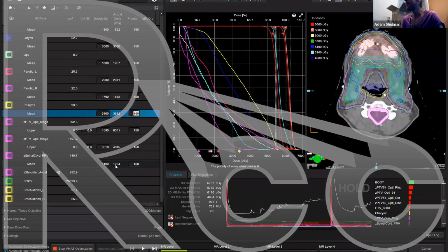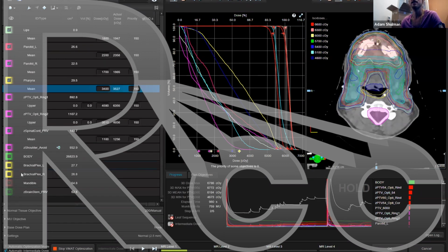I hope everyone is starting to see a pattern in how we're optimizing. Again, if you look at the isodose lines on here, you think, oh, this is a terrible looking plan. Again, trust the process. It'll look really, really nice by the time we finish. And again, these max doses, we'll focus on a little bit more in section 2 and mostly in section 3 on these 3 max doses. And these are inside of PTV 54. They'll easily achieve their max of 60.